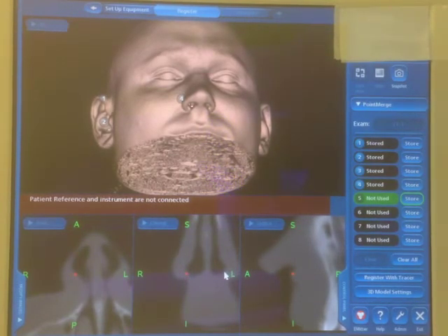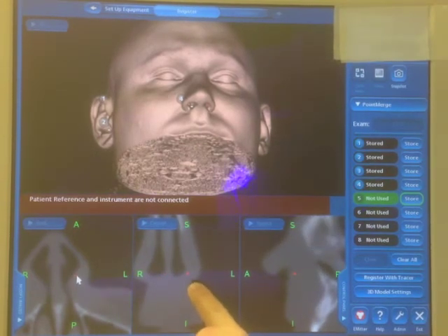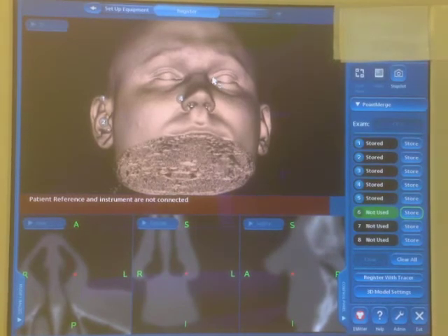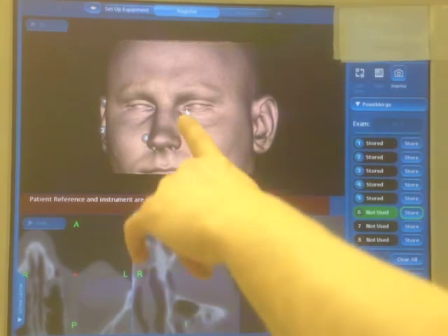So we're just going to do the same points on the other side. I'm going to be watching here while I'm dragging over here. I'm going to go to where it just turns into a solid bar on the sill, and I've got it perfectly right there. Now I can cheat and go up to this one, pick the caruncle. You can see there's an air pocket right here, so I'm going to drag off the axial and wait for that air pocket to disappear, and there I can see, perfect.